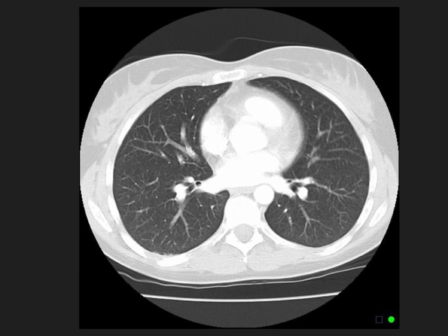Now, if you don't already know this, with a CT scan, you're looking up from the patient's feet as if they're lying on the table. So in this case, what we see on the right is actually the patient's left because they're lying on their back and we're looking up through the bottom of their feet as if their toes are in the air. If that doesn't make sense, you're going to have to Google a picture of what a CT scan looks like or what position a patient is in, but just keep that in mind. So this is again normal. We see lung markings, we see vasculature, we see everything that we expect to see.